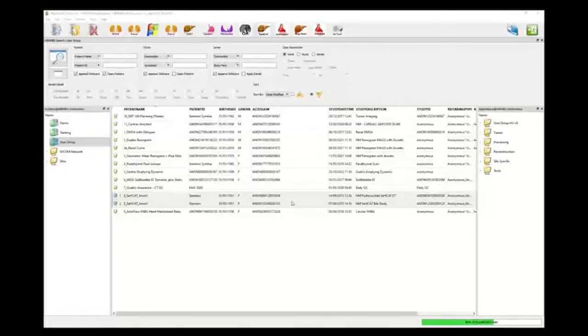Okay. So one of the new applications as part of version 6 is ROI ratio functionality. There's a couple of different clinical applications for which I have become aware that people are using these, and we have responded to that.